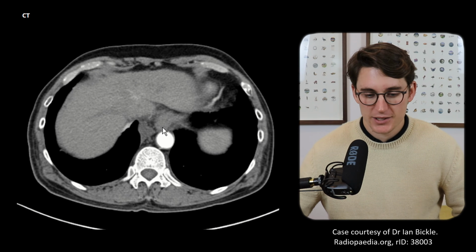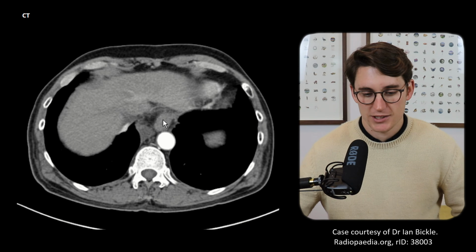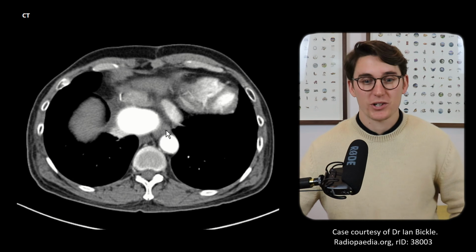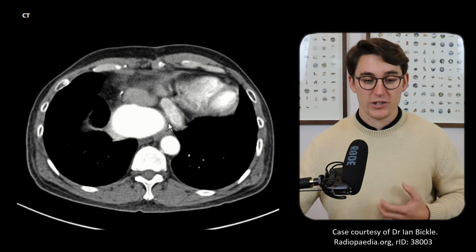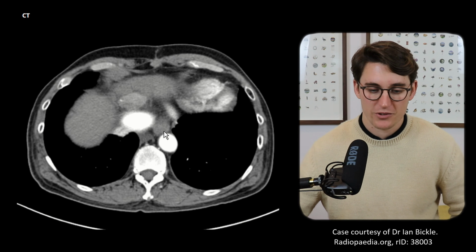And the esophagus pierces the diaphragm at about the level of T10 and heads into the stomach there. You can see the esophagus going down like that. And you can see why, if we have gastroesophageal reflux, that esophagus is right next to the heart here. So you can see why reflux can present as a centralized, almost cardiac chest pain, quite hard to differentiate.